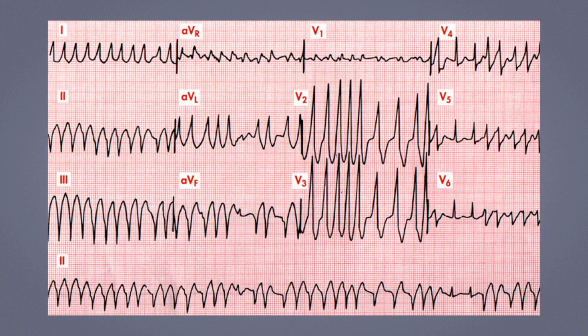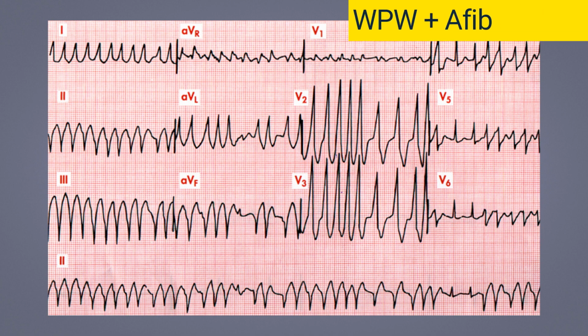In fact, this electrocardiogram is of a patient with ventricular pre-excitation syndrome, meaning he has an accessory atrioventricular pathway and has developed atrial fibrillation. Hence, sometimes the impulse generated in the atria is conducted by the standard conduction system, and we observe normal narrow QRS complexes. At other times, this impulse is exclusively conducted by the accessory pathway, and we see an extremely broadened QRS complex. Occasionally, there's mixed conduction between the accessory pathway and the atrioventricular node, resulting in slightly broadened QRS complexes.